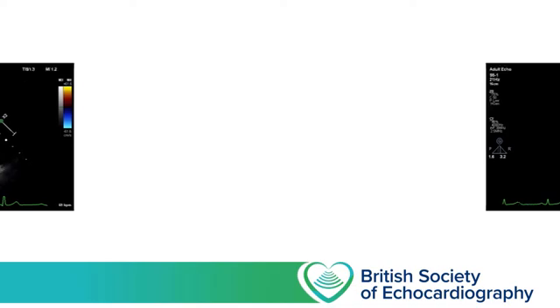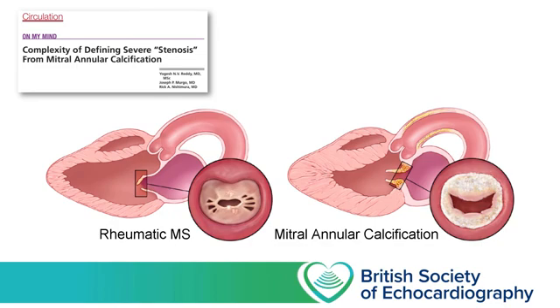Alright, now we've seen some normal mitral valves, let's take a look at some pathology, and we're going to start with mitral stenosis.